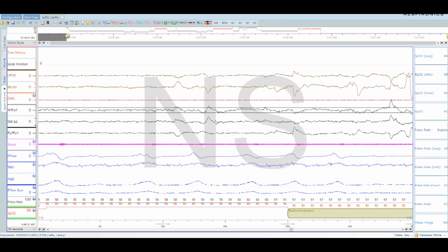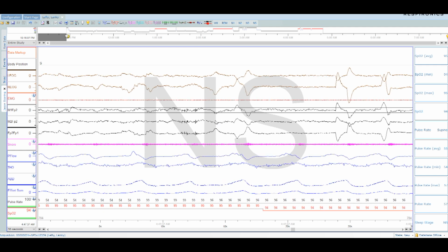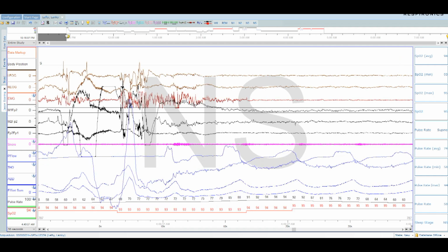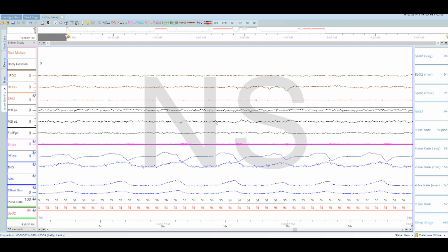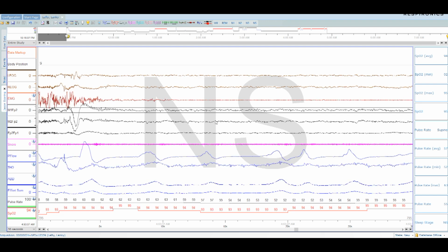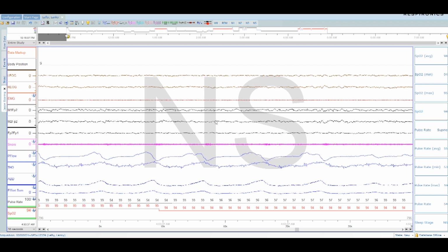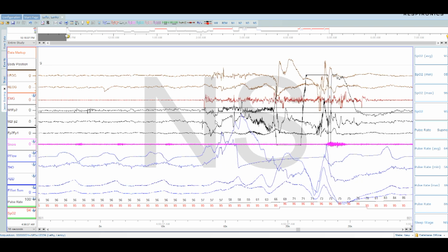And you can pick up the breathing decreasing and increasing, waxing and waning, even though we're on a 30-second trend as I move along. Very normal for REM sleep. What you're not wanting is a specific look of a hypopnea that will occur. You'll see a massive desaturation. You'll see a huge EEG spike like this one here. It doesn't look like it's really caused by anything.